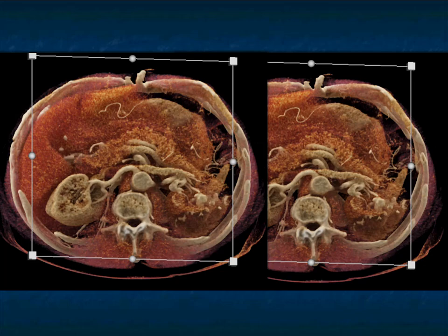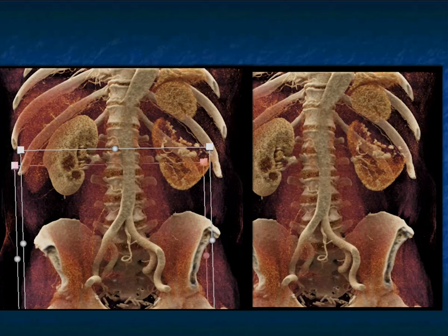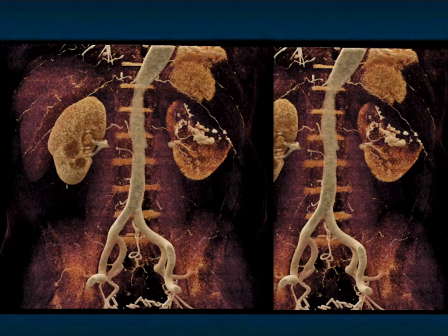And you can see just the vessels and see everything a little bit better on that cinematic rendering. So again, using 3D, a combination of MIP and volume rendering, or even better cinematic rendering, will prove to be very, very helpful. And adjusting the parameters on the cinematic rendering is especially valuable in this case.